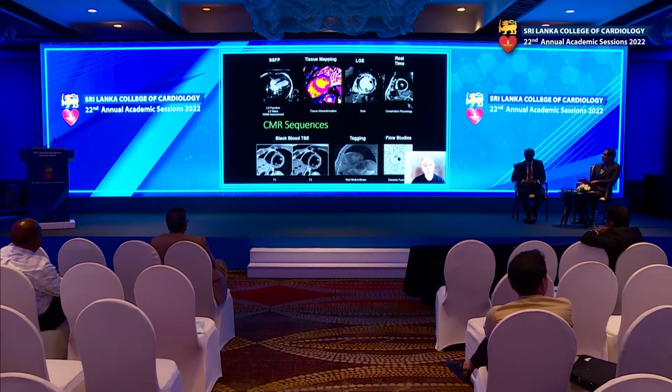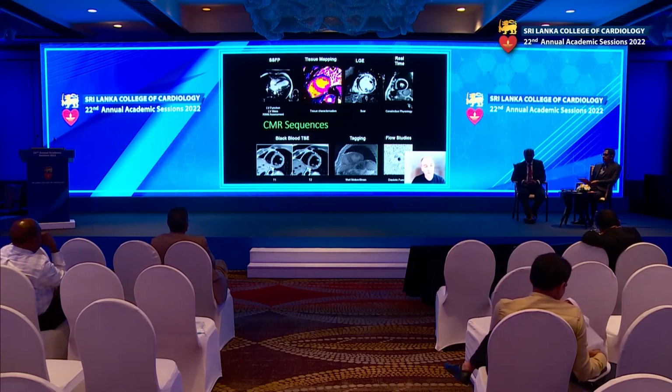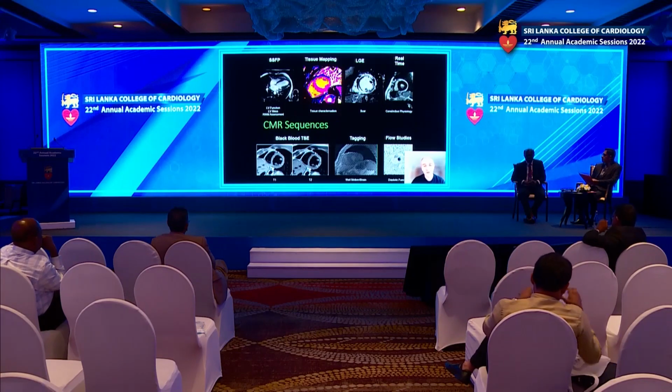We can do real-time imaging, which is really a mimic of echocardiography. The resolution is not as good, but it does allow us to image patients who have arrhythmias and sometimes look at the dynamic changes in cardiac size during respiration. We have black blood sequences, which allow us to look for specific conditions like myocardial edema. And then we have other sequences where we can tag the myocardium to see how well the contractility works, as well as flow studies looking at flow through blood vessels and throughout the cardiac chambers.